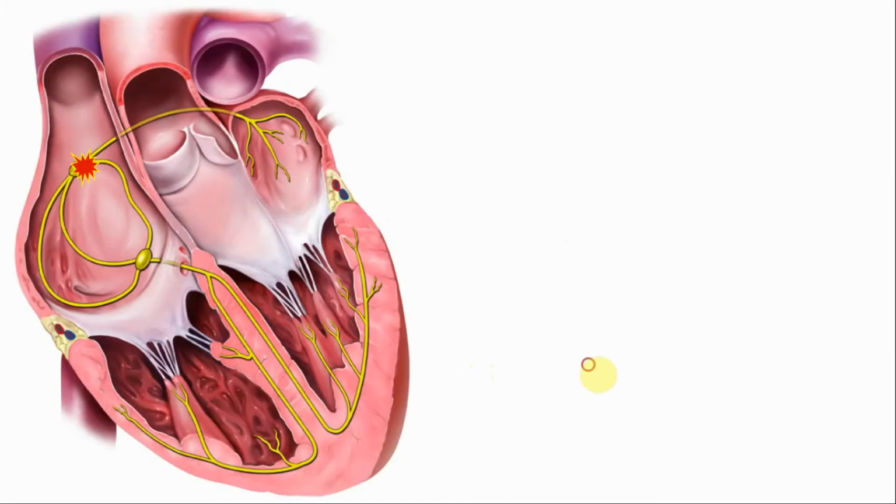to understand exactly what happens in the normal ECG. Then that will be easier for us to understand what happens in second degree heart block. So let's get oriented with this picture and the animation.